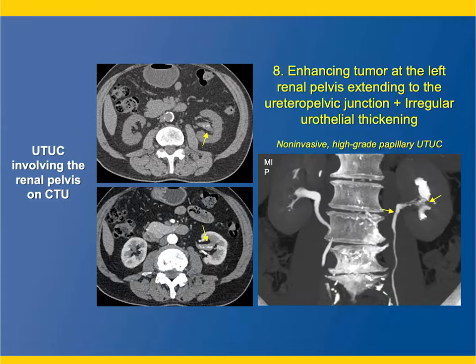Infiltration of the patient's left renal pelvis. You can see there's some faint calcification on the non-contrast scan, which persists through the study. Occasionally, transitional cell carcinomas will have calcification. It's not that common, and you can see here very nicely the destruction of the calyces.